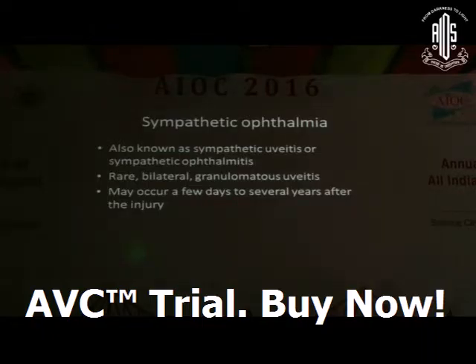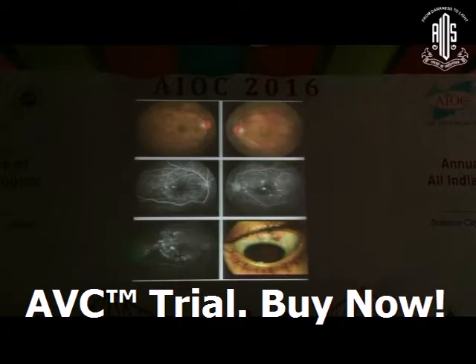Sympathetic ophthalmia is another similar condition, but the history is different. There's a history of injury. It's also called sympathetic uveitis or sympathetic ophthalmitis. It's a rare or uncommon bilateral granulomatous uveitis. It can occur a few days to several years after the injury. Almost a similar picture on FFA, just like VKH syndrome, and even on histopathological examination also. This is the injured eye. These are the clinical pictures with multiple exudative detachments, pinpoint leaks here in both eyes. This is a sign of the injury.